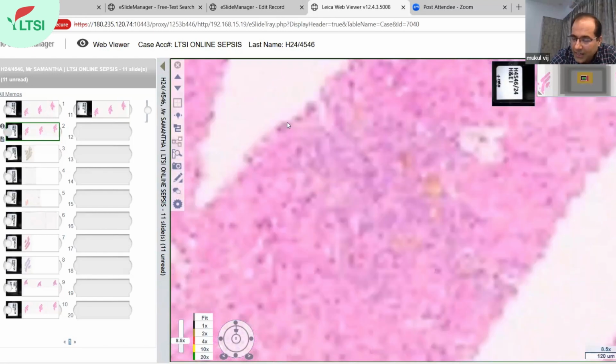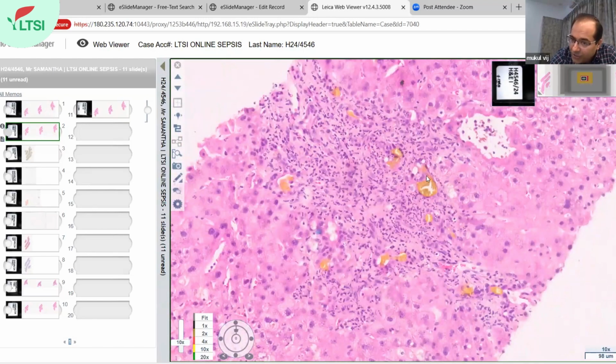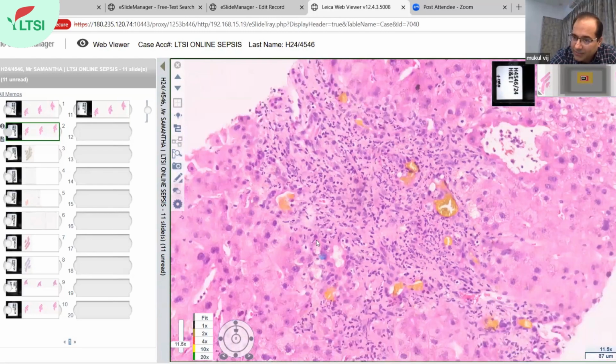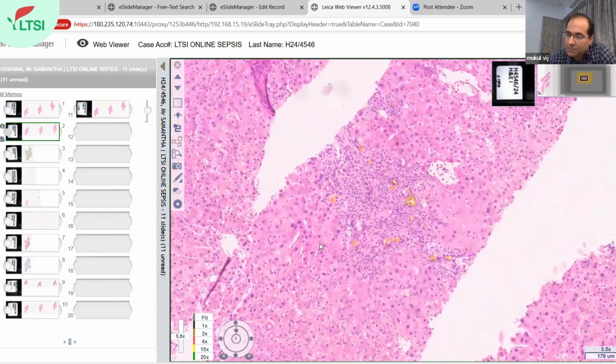So overall, we are seeing an expanded portal tract with inflammation, bile ductular proliferation at the periphery, these marginal ductules which are dilated and have these biliary casts throughout. They have a lot of these bile thrombi, and inflammation which is mixed and also infiltrating the ductules. So this is classically known as cholangitis lenta, and this is because of the septicemic injury in the patient.